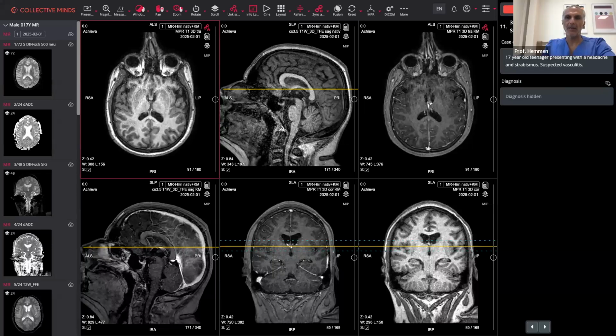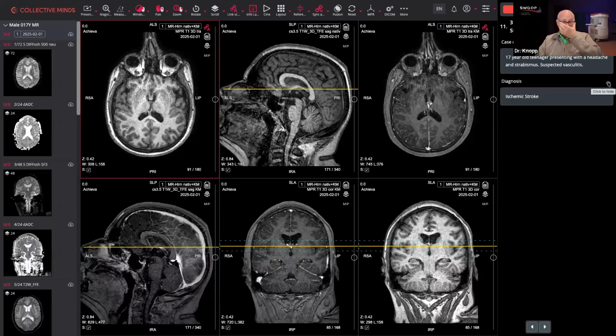But again, the beauty, or the ease of it, is that they can rescan him very quickly. Again, I've ruled out with a low field that there's anything that I have to take immediate action on. So no signs of intracranial bleed, no trauma, no tumor, no extension of ventricles. So I could rescan after 12 hours, for example, right? Right, absolutely. So in the interest of time, maybe we just do one last case.